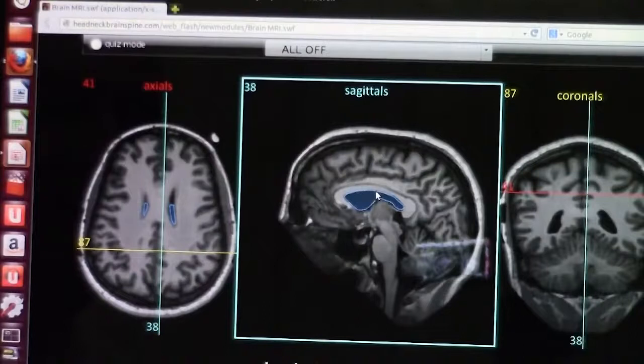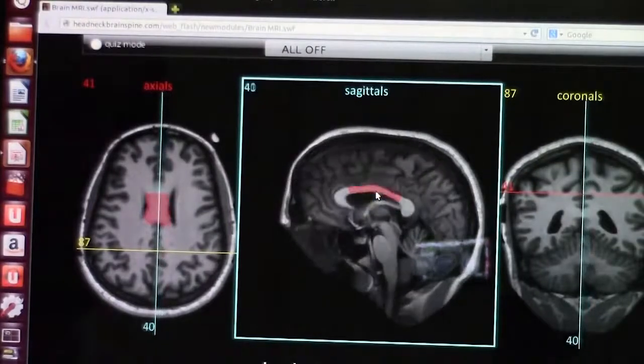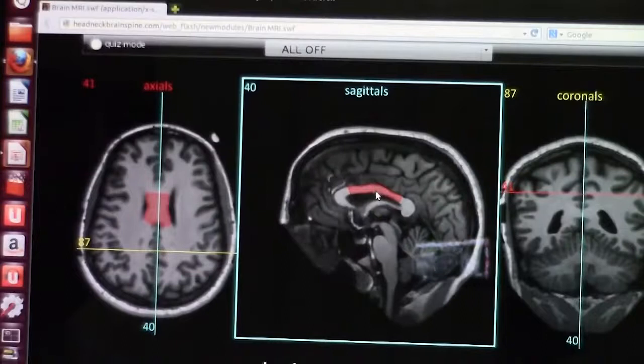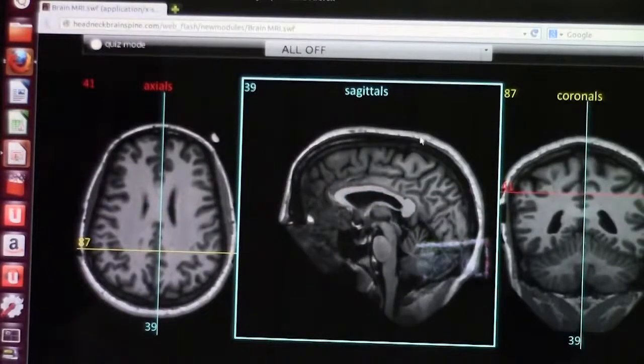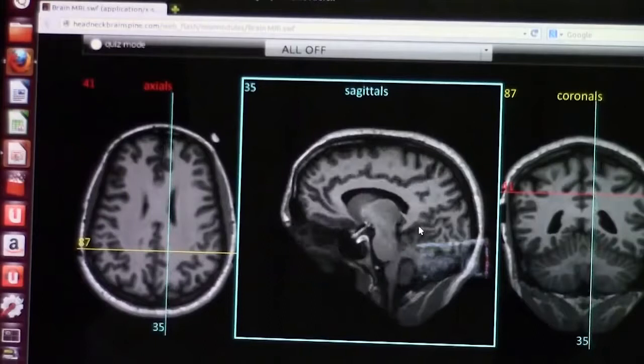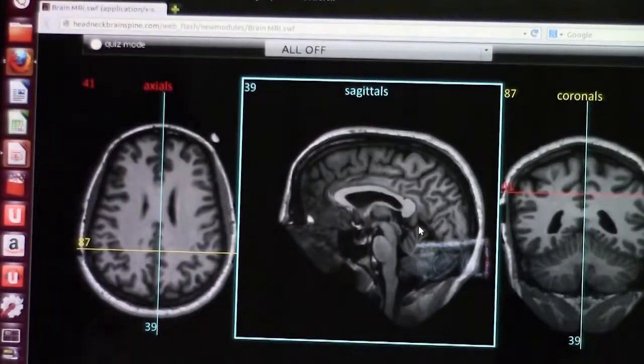Now, if you look at the sagittal T1 cut, remember T1, white matter would look white, gray matter would look gray or darker, fat would look white, bone like here would look bright, bone like here would look dark. This is the bone marrow here, as you see. This cut is extremely helpful to look more specifically at certain structures. One of the classical structures we look at on the sagittal T1 is basically the corpus callosum.